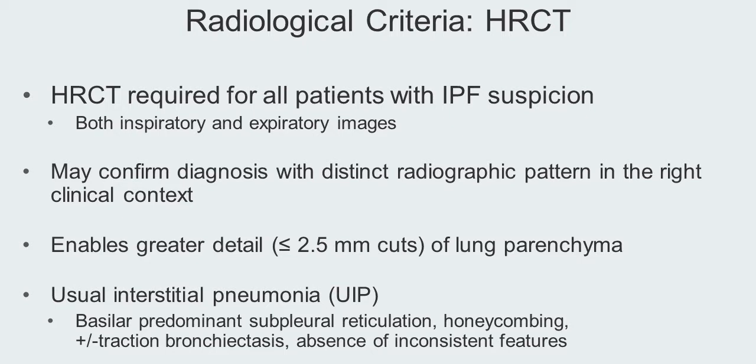If there's a distinctive radiographic pattern in the appropriate clinical context, it might be enough to make a diagnosis of IPF. So you can have a UIP pattern, or you can have a possible UIP pattern. A possible UIP pattern by itself is not enough to attain a diagnosis, but together with the right clinical presentation, it could be sufficient to attain a clinical diagnosis of IPF.